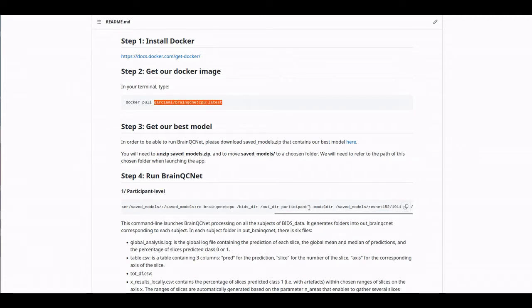After that you can pass a set of options that are defined in the run.py script, so feel free to have a look at it. Here we specify the model directory, just to say that my model is stored in the saved model folder. This is useful because you could have many models stored in this folder, and we want to direct the app to the correct model.